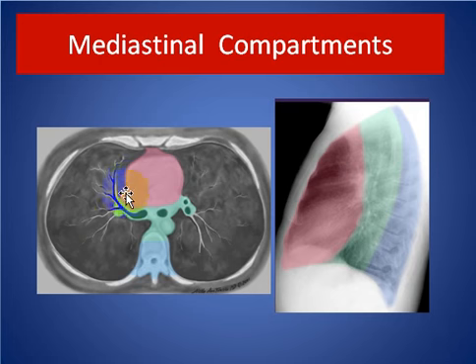As we see here, the posterior mediastinum is shown in the blue color.